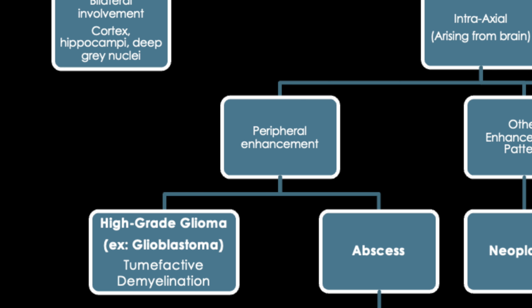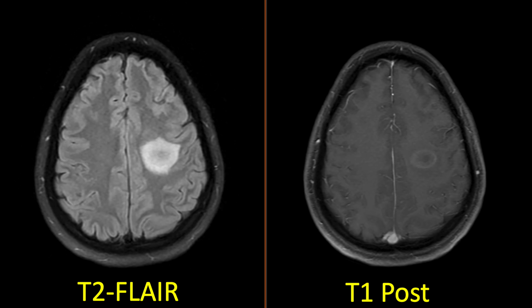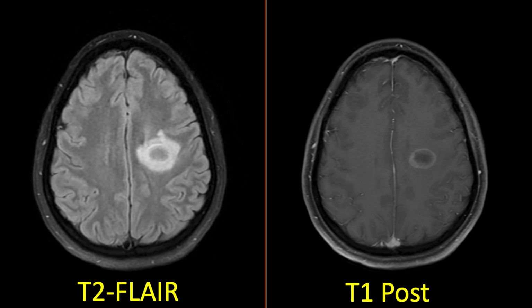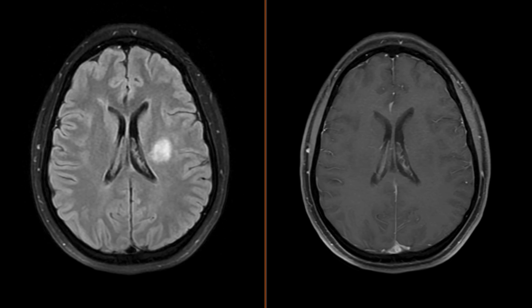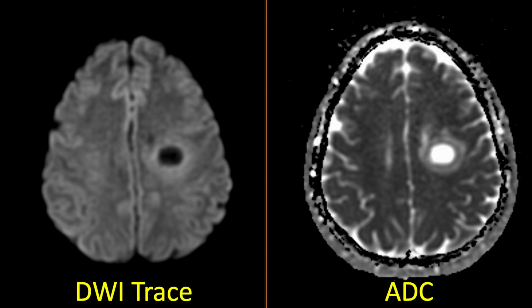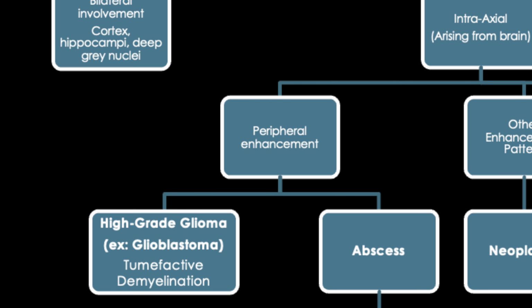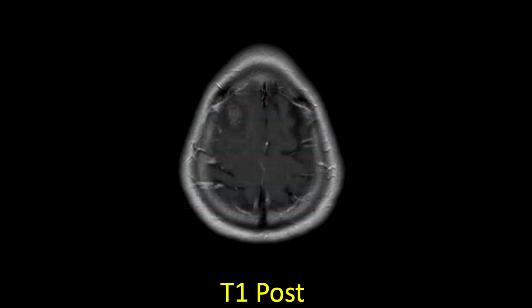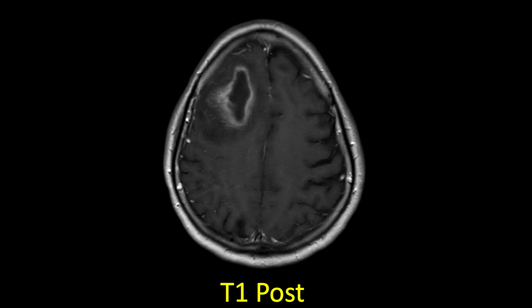Also keep in mind that confounding case of tumefactive demyelination, although this is not the common presentation of demyelinating disease and pretty rare. This also has substantially less mass effect than you'd expect for a cancer of this size, and the restricted diffusion is oddly ring-shaped, following the shape of enhancement we see. The other non-neoplastic peripherally enhancing etiology to consider is a cerebral abscess.